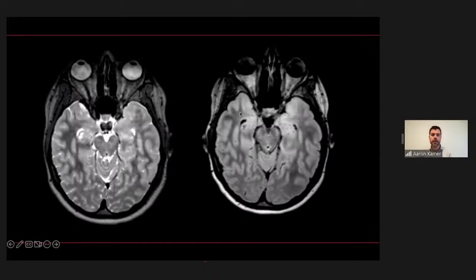Sometimes you'll see how nicely dark the white matter is on the normal side and how muddy or dirty or hazy it looks on the abnormal side.